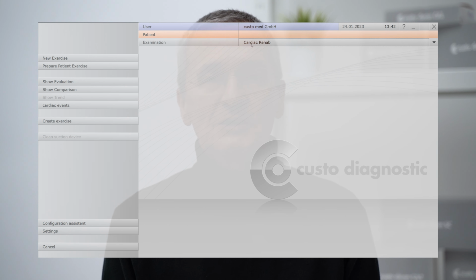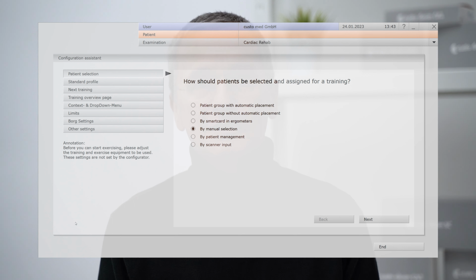My name is Heinz Löwis. I am a member of the Rehab team, and today I would like to talk to you about how I can put together a training group using the patient management.